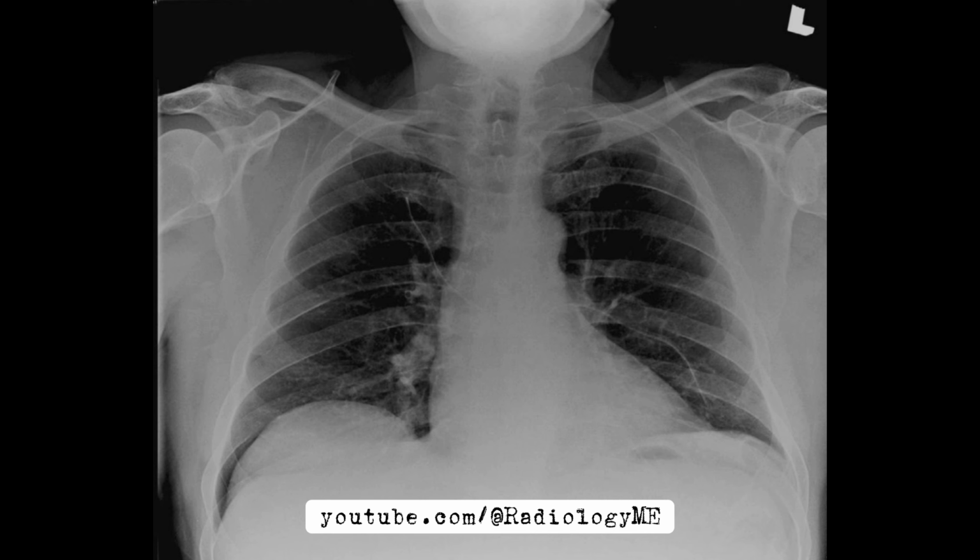What we see is this linear structure extending from the right upper lobe pulmonary artery to the left lower lobe artery. This is important because we're looking for signs of a PICC line. And guess what? There's no PICC line visible in the chest anymore. So, right off the bat, we know something is off. Let's think for a moment.